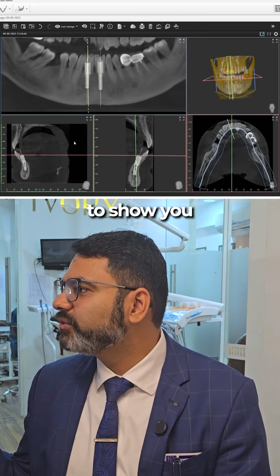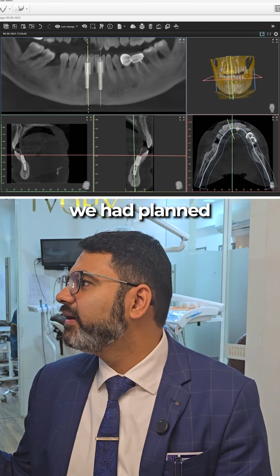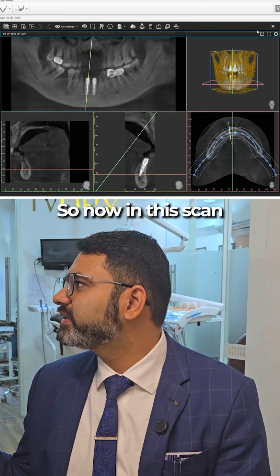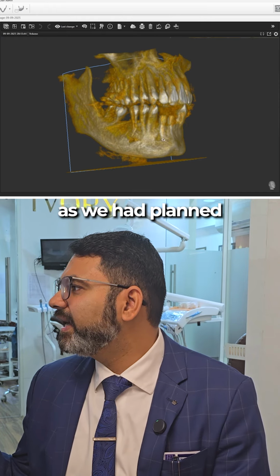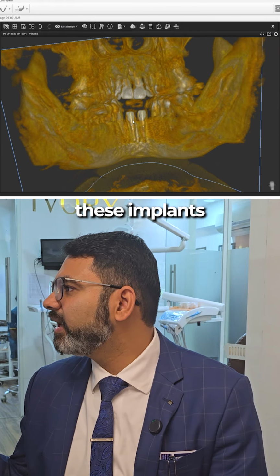And now I'm going to show you the post-operative view of implant placement. So this is what we had planned, and now let us see what is the final position. So now in this scan, we have taken this post-operatively, we have done the implant surgery as we had planned. We had placed the implants inside. In the 3D view, you can see these implants over here.